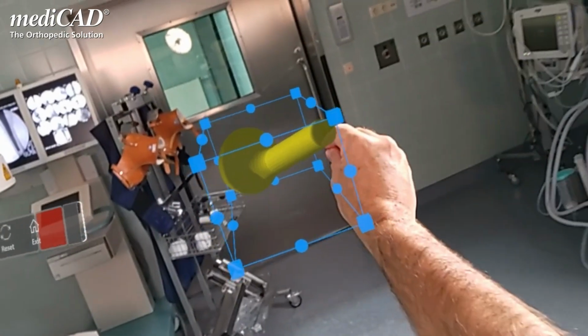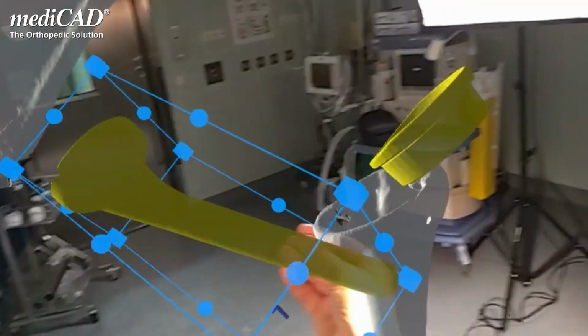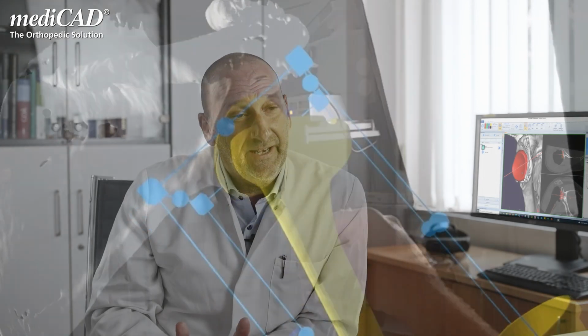If I want to convince a colleague of the mediCAD MR features, for example, I recommend them to just put it on. See your patient information in 3D in front of your eyes. Walk through the model, turn and twist it, and then realize the many possibilities you have with it.